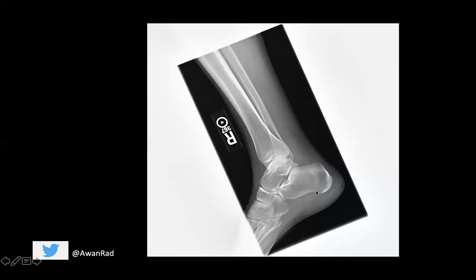So this is an abnormal finding, a very abnormal finding. In fact, this is an example of what a calcaneal stress fracture would look like. And once you've seen one, you see them all, because this is exactly how all calcaneal stress fractures look. They look like a linear area of sclerosis that runs perpendicular to the long axis of the calcaneus. And notice that there's no break in the cortex.